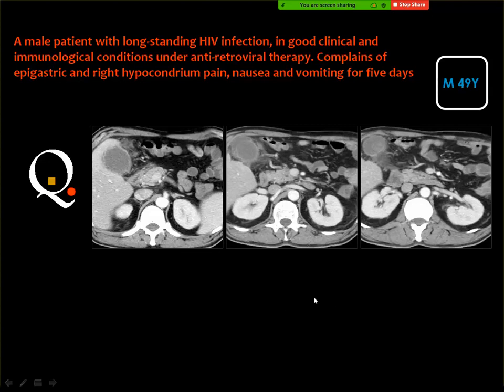Adenomyomatosis? No. The wall is not thick and does not contain cystic changes. But whenever you see this, if the fluid is circumferential around the gallbladder, this is pericholecystic edema.